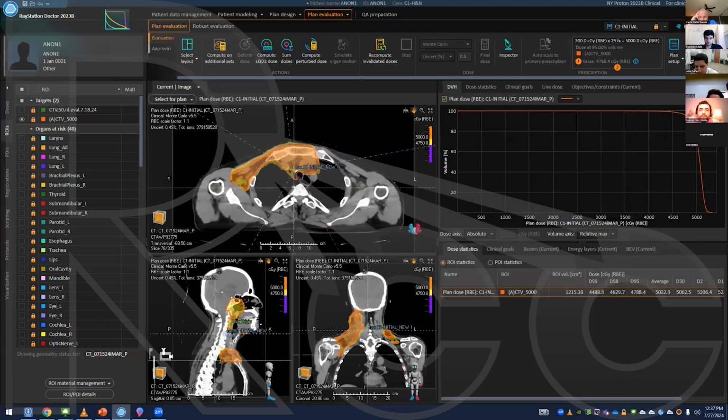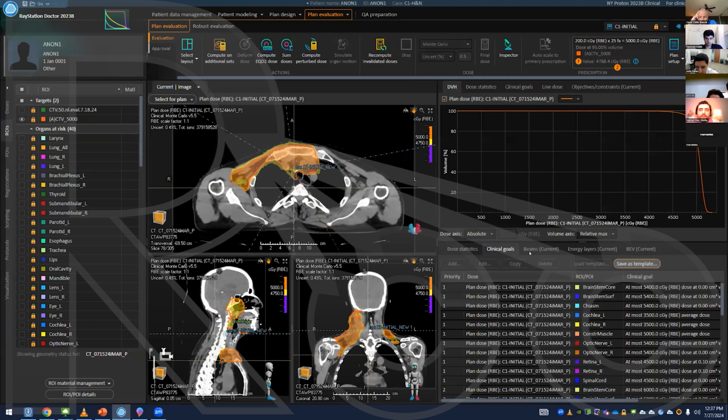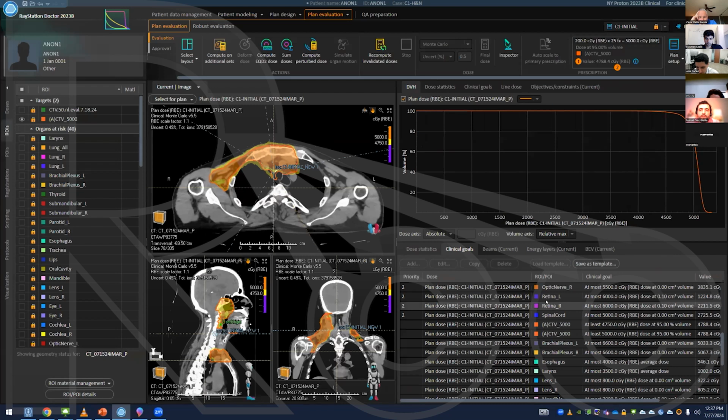We're now going to take a look at our quantitative clinical goals. So when we come down here to the CTV, one other comment for proton plans, there really isn't this concept of a PTV. You contour a CTV, and then the planners will do this concept of robust optimization. So you plan still to this CTV in essence.